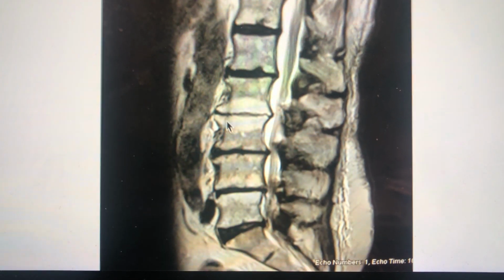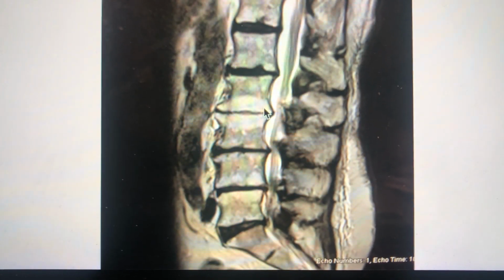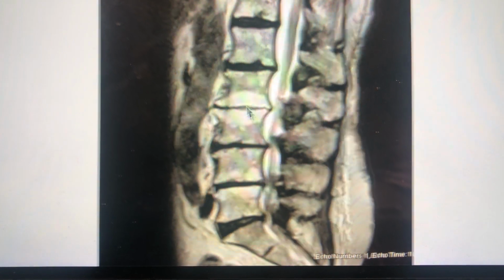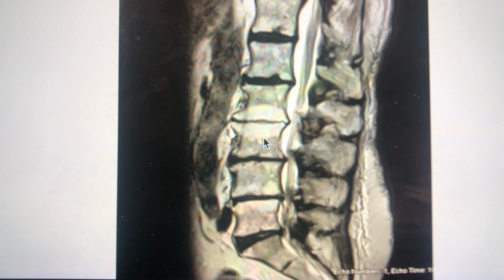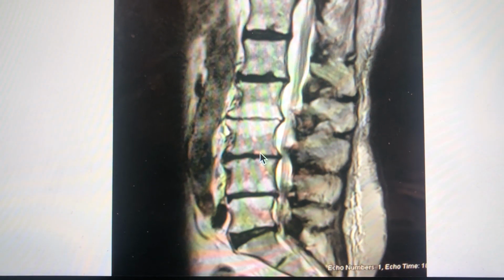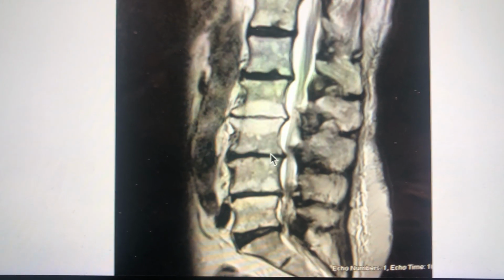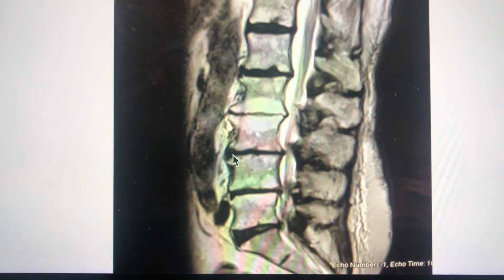You notice the large area of edema of the bone on this T2 weighted image as a result of the pressure on the bone and the lack of normal diffusion across the disc, which is not functioning much like a disc anymore. You don't see the same modic changes or edema of the end plates of these vertebrae, but you do see a little bit of it here and modestly here.